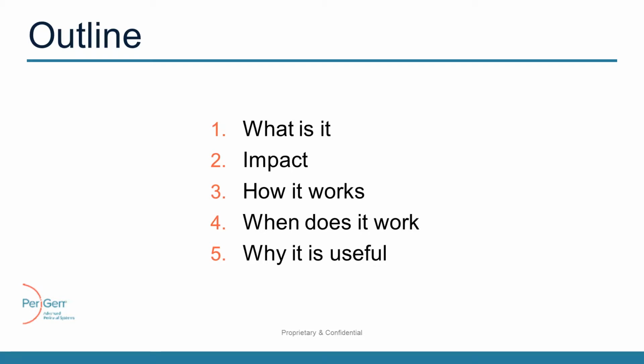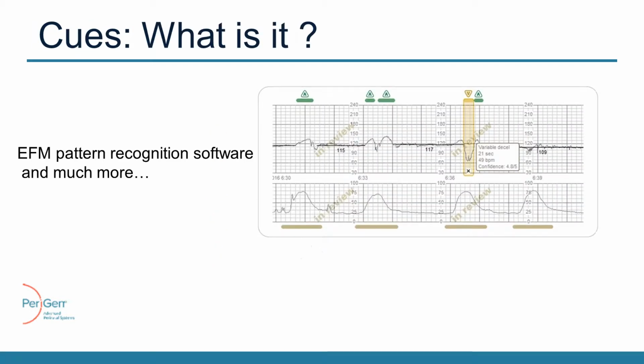Cues, what is it? Well, it is EFM pattern recognition software. As you can see in the panel on the right, it identifies baseline, accelerations marked with green upward pointing triangles, decelerations marked with brown downward pointing triangles, and contractions.